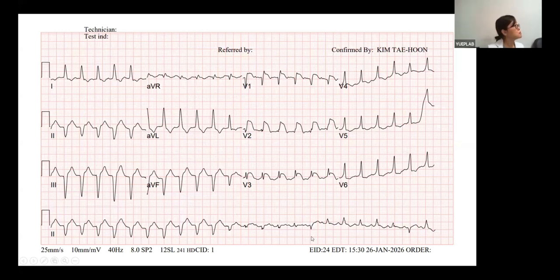Yeah, I presented this case, so I know about the patient, but thinking about the ST elevation, the conduction system has been very injured, so this keep-changing QRS morphology suggests a rate-related conduction block, block change.